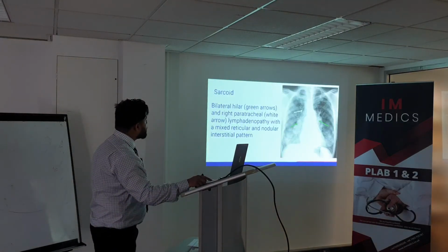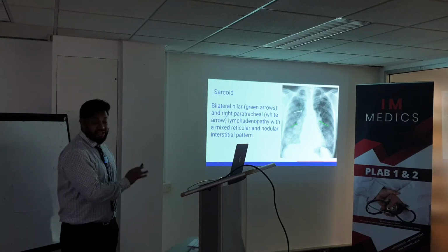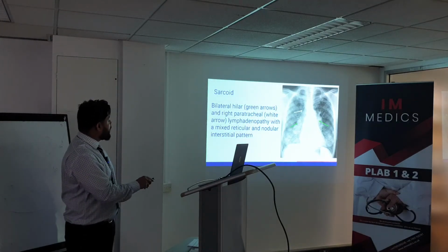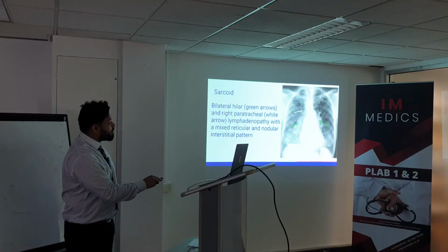So let me show you, for example, this one. Look at that. He's got a very good picture. This is bilateral hilar lymphadenopathy. Can you see that? Can you see the hilar region? These are the hilar regions, and they're both fluffy.